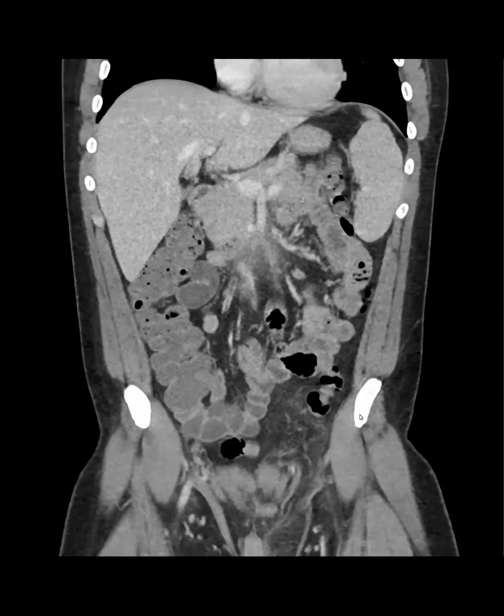So something to remember in the spectrum, I guess, when we see very bright T2 lesions. Looking back, one thing I was reading about IPMNs or mucinous lesions was that you should expect somewhat more nodular enhancing components, which this one didn't have as much. But I don't know how prospectively we could have said anything different.